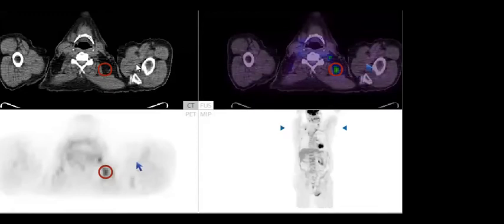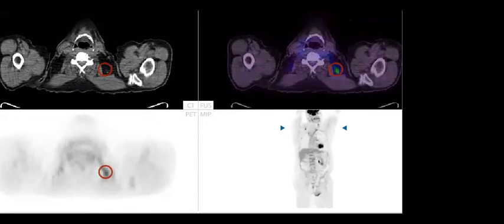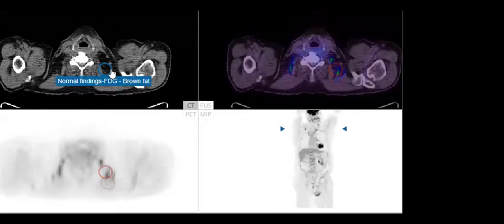They like to show you in the exam, as an MCQ or even in a short exam, something like this brown fat, to be sure that you know that it is just a normal finding. In the lower neck, it will be difficult, because if you already have lymph node metastasis, it will be challenging to differentiate between the normal fat and the abnormal lymph nodes. That's why it is important that you should know the anatomy and the neck spaces as well. And you should also know how the lymph node looks when it is infiltrated, how it appears in the CT.